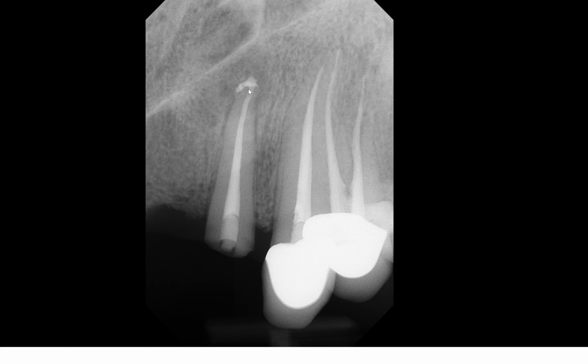Can you pick out where the interesting finding is? Well, as a matter of fact, I've already given you the title, and you probably know what it is. So, we're looking at a mesiodens. There is a mesiodens on this radiograph, but if you didn't know, try to look for it and just ask yourself, would you have been able to identify this mesiodens if I didn't tell you from the title of this video? So now you know what I'm looking for. Where is it? Can you find it?